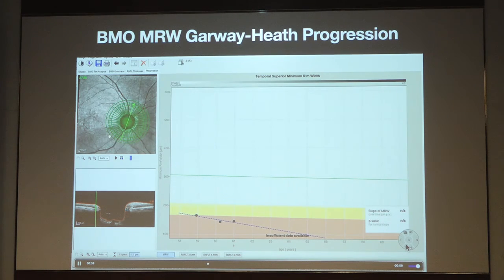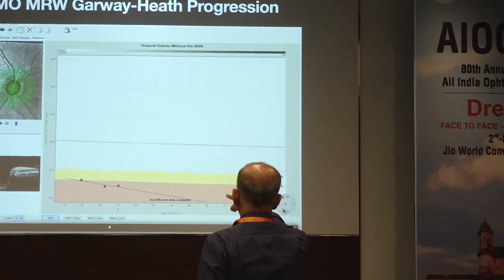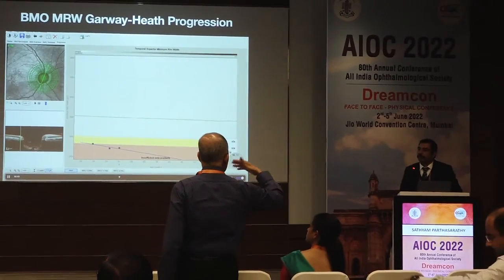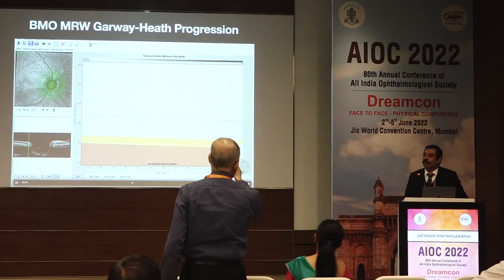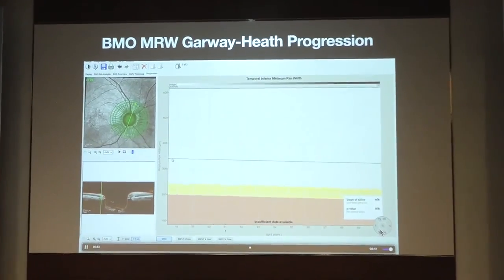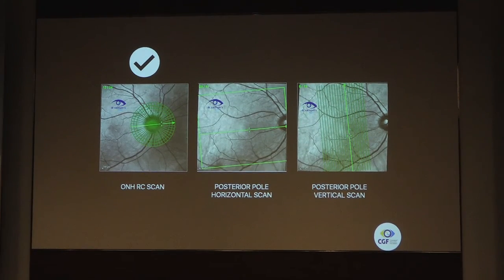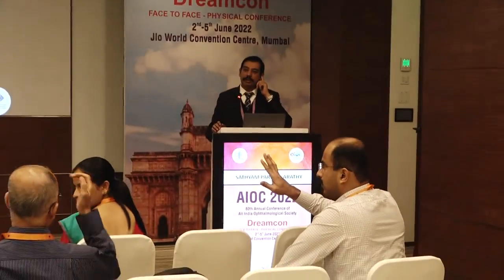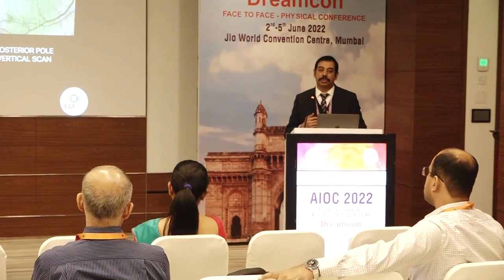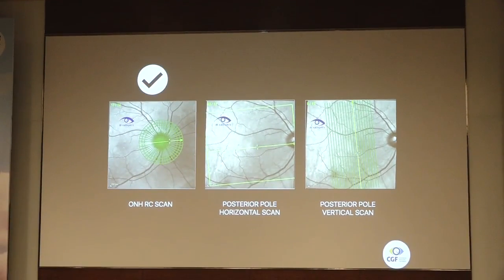See, if it is visual fields, I know it can go up and down. That means if you're having spots coming up and down the regression line, then it indicates that there are outliers. How do you get an outlier? If you have not marked properly, then you will have the outliers. As you rightly pointed out, you see an outlier in imaging. Yes. You have to revisit your image. Absolutely. We'll have the discussion time, then we'll see that. That is an important point which you have raised, though these are all automated things, each visit we have to do the proper BMO marking and the ILM marking, otherwise you are going to have problems.